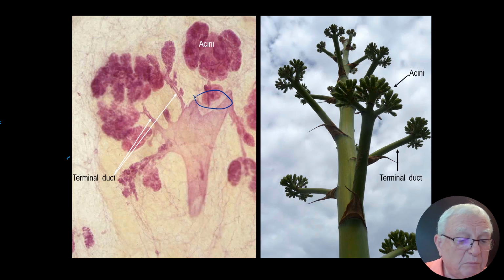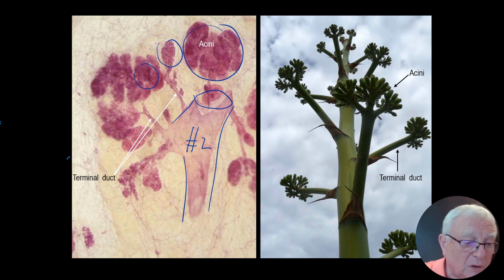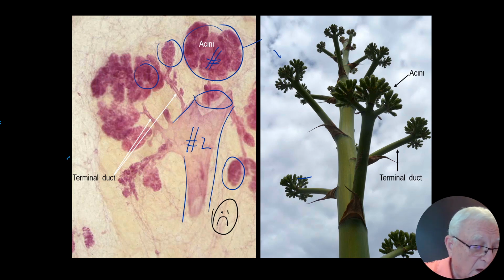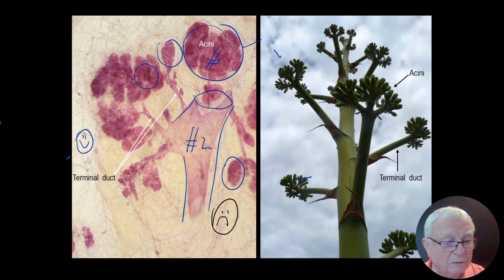This is what we call the basic building block number 2, the duct. This is what we call basic building block number 1. How come that they are varying in size? Well, one of your children is taller than the other one. Both of them are normal, within certain limits. So this was basic building block number 1. And here comes something which makes us look like this, the yellow, the fibrosis. And here is something that makes us look like this. It's called adipose tissue or fat.